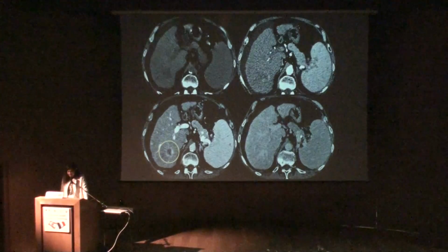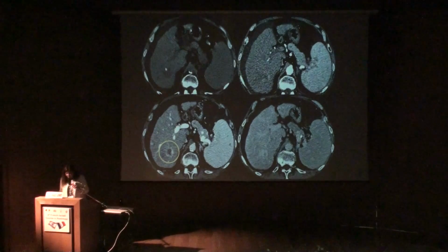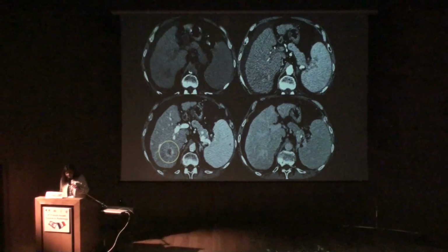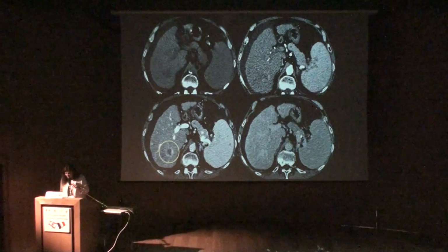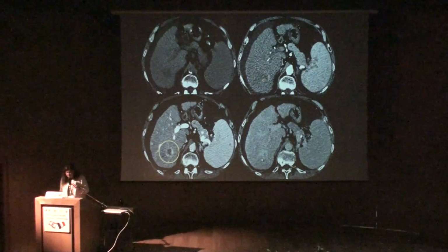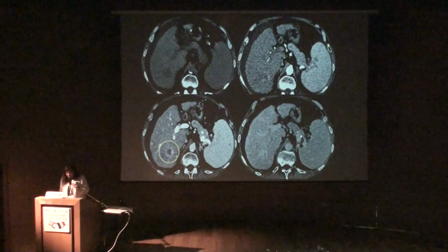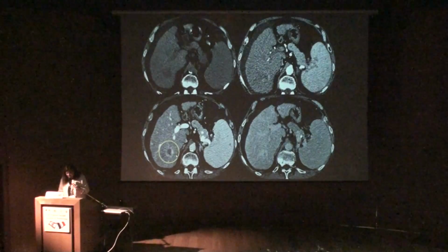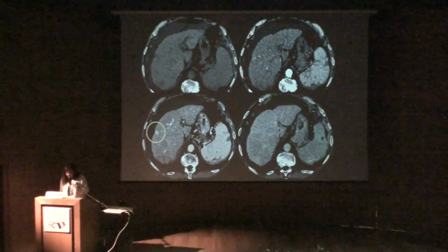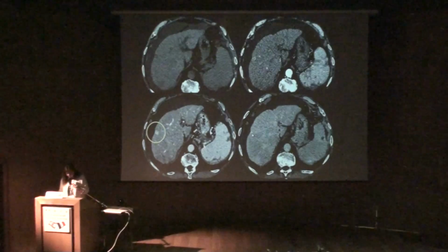So if you look, for example, at this patient, you see this is a liver cirrhosis. You see here the lesion, and after, on the arterial phase, this here is the lesion, and you have this rim enhancement, then on the portal phase and a progressive enhancement on the delayed phase. That doesn't look at all like an HCC lesion, but it's typically a cholangiocarcinoma on liver cirrhosis. And this patient has a second lesion that you can see here, with enhancement on arterial phase and on portal phase and delayed phase, no washout.